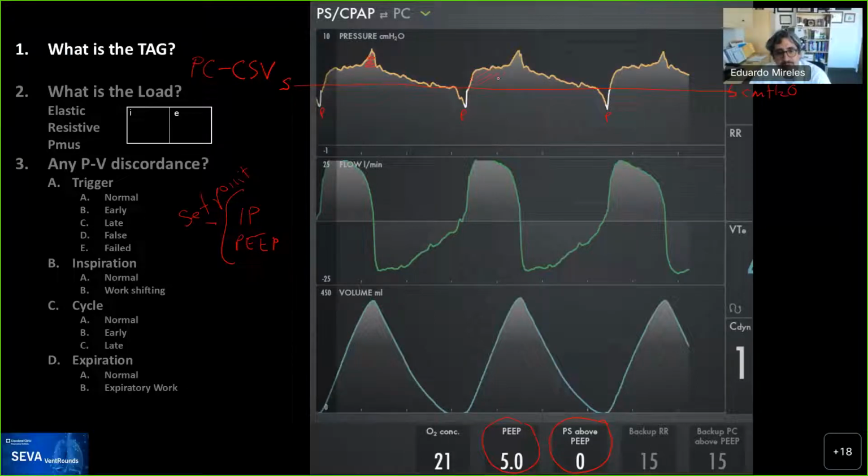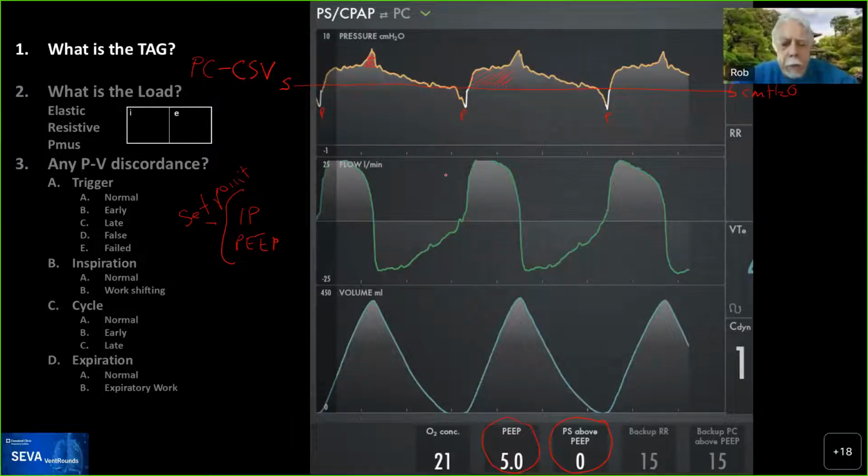And Shravanti, you asked if this was R, which is servo. So we're going to see an example of it, but servo means that as the patient does more effort, the ventilator delivers more effort, and we'll see some examples here.